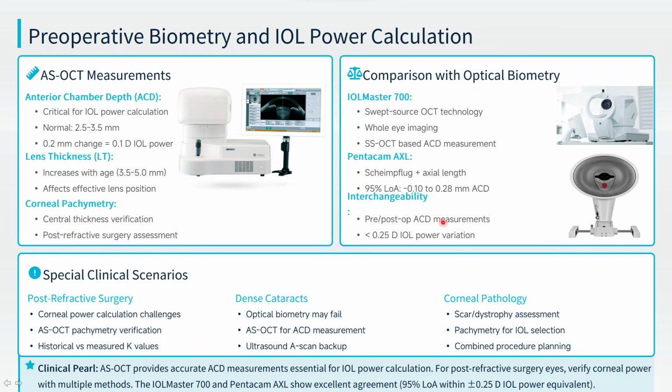All these provide precise measurement for the axial length and then very accurate measurement of the power of the lens needed, especially in special scenarios like post-refractive cases after LASIK procedures, with proper assessment of the total power of the cornea and proper measurement of the effective lens position.